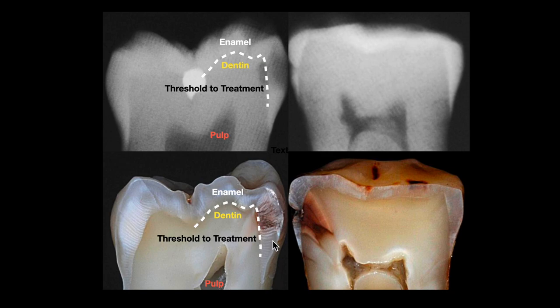On this side, that discoloration, the red and the orange, is the most intense towards the outside of the tooth, but gets a little more faded as we get further in. Even still, that does mean that bacteria has already started to destroy the tooth, and it's heading towards the nerve or the pulp. In this case, in order for us to do a filling, we would have to remove quite a bit of the tooth, and most likely if this was still in a patient's mouth, they would feel quite a bit of sensitivity after, because the bacteria has already gone so close to the nerve.